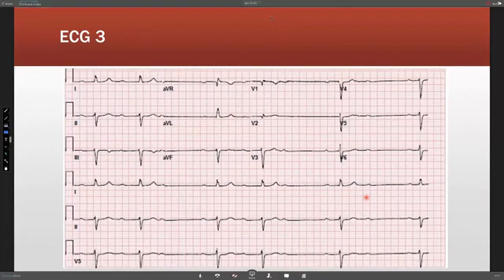Paroxysmal AV block is well described, and it can be episodes of non-conducted complete heart block or even high-grade AV block. Could be both, because paroxysmal AV block is more of a clinical diagnosis. But by EKG diagnosis, it could be either high-grade AV block or third-degree AV block. I mean, that's how I look at it. This would be the most appropriate explanation, because the EKG has dynamic changes.